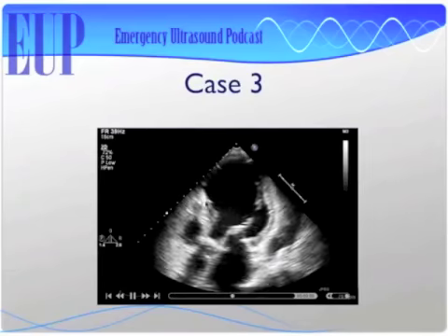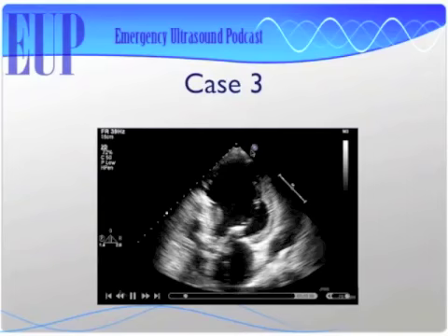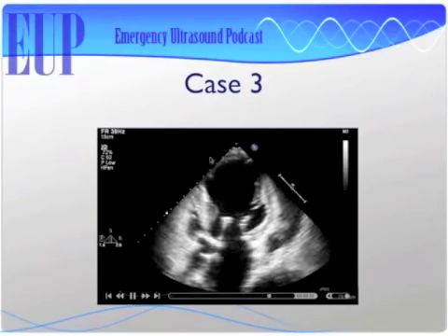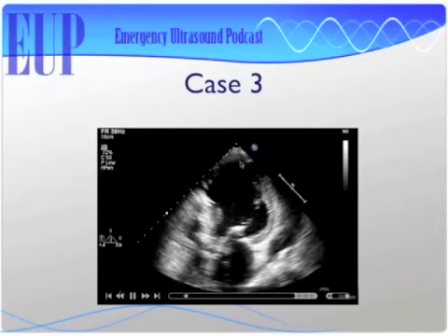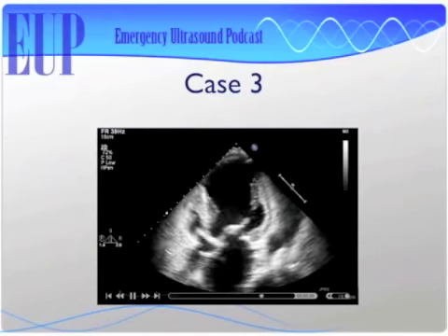So this person has some proximal LAD working, but everything else is pretty much out. It's almost ballooning out here towards the apex, huh? So this is a little bit of dyskinesis. We got dyskinesis over here, and at least hypokinesis, maybe akinesis over there.